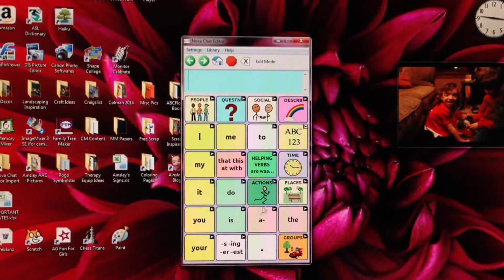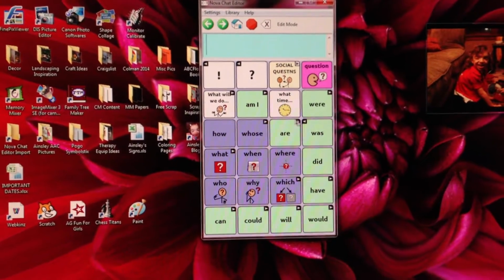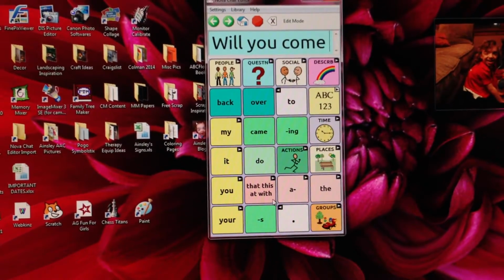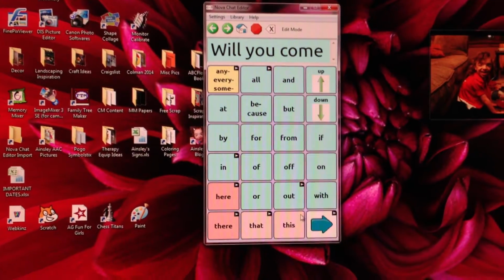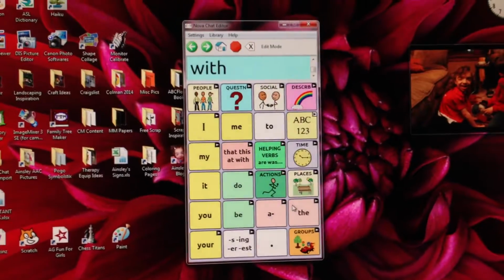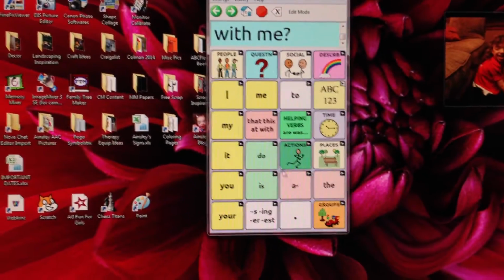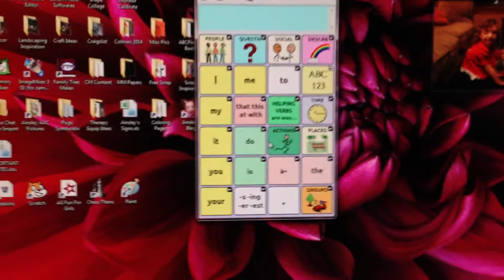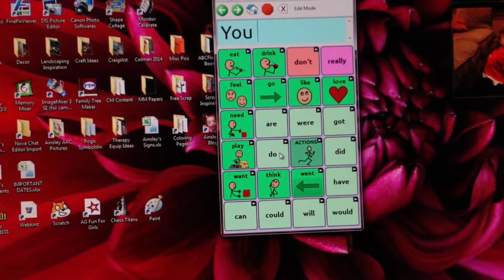So I'm going to say a sentence here. Will you come with, where's with? It all looks different because I'm used to my buttons and my locations. Me. Okay? So there's a sentence that you can say. It's fine. It's great. Now we're back at the home page, and I'm going to say, you and me are friends. You. Okay, I'm stuck.